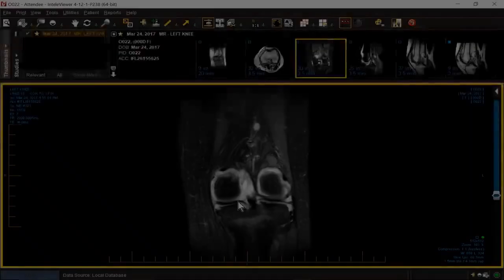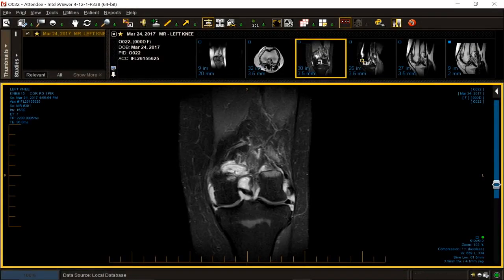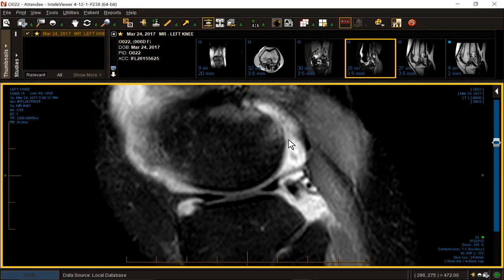That's not an injury. That meniscus is extruded because the attachments are being proteolytically digested by aggressive RA, and the meniscus is no longer able to hold, even with the patient lying on their back. And that's why this knee will degenerate without early, immediate treatment. That's the value of MR.